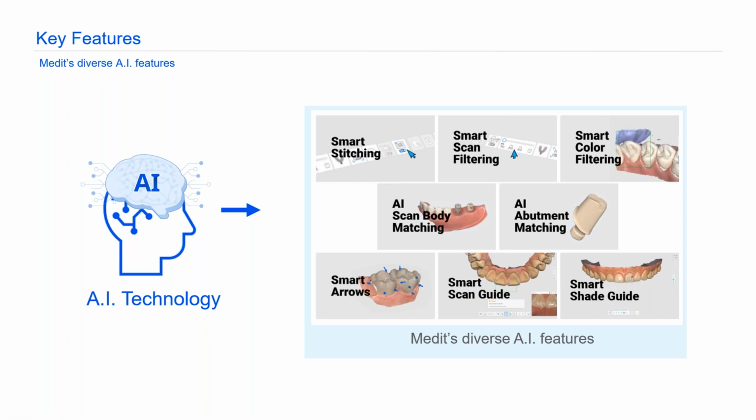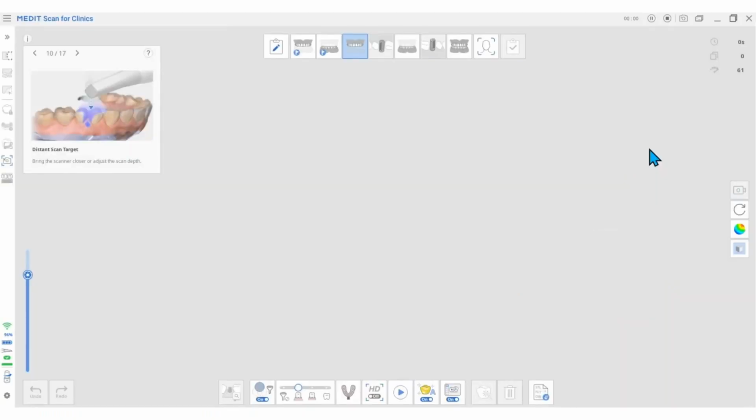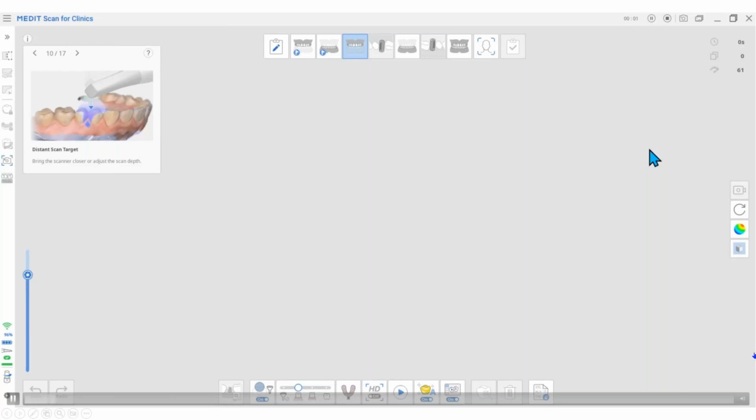Before again getting into MeditLink, I'm going to just show a quick little video here regarding the AI engine. So let's go ahead and play this.